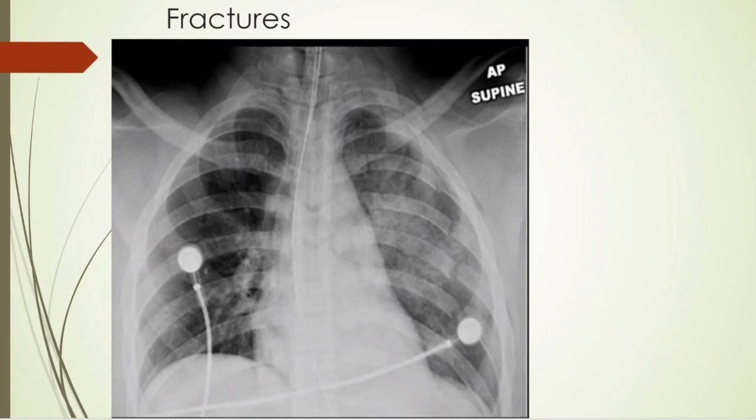You can see here, if you do the A, here is trachea coming down. Looks like the carina is difficult to see here, and I'll show you a method of picking out the level of the carina by counting the vertebrae just a little later on. And then B for bones, look at the posterior ribs, turn on the anterior ribs.